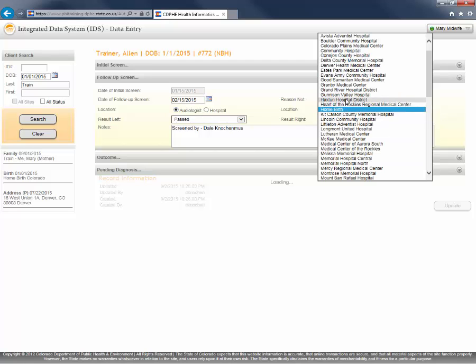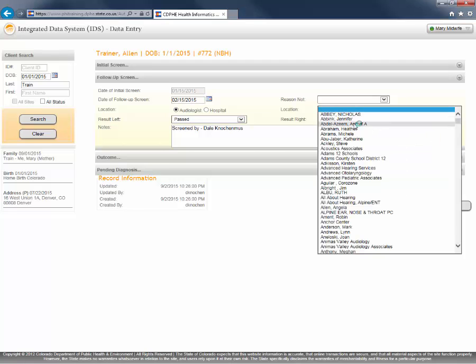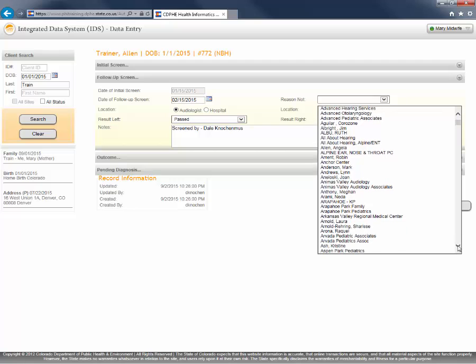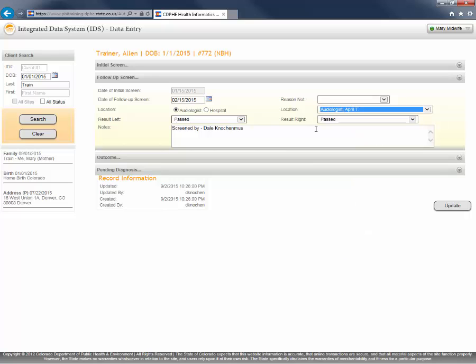And then I'd click on the particular name of the person, which is running a little bit slow here, but then I'd choose the name of a person, and I think I have a test person over here of, let's see, April audiologist.